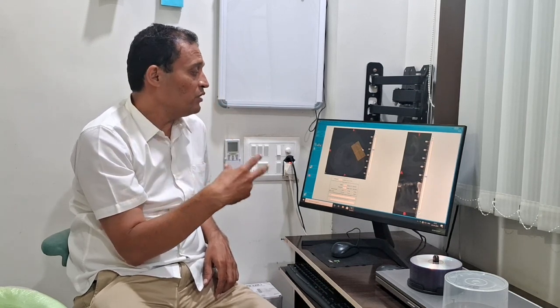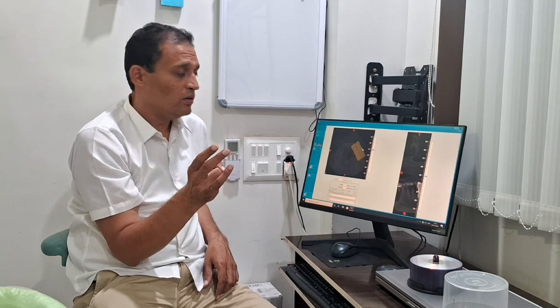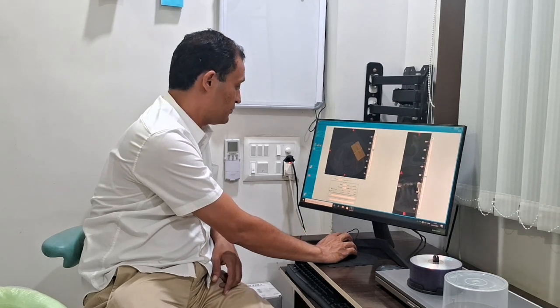This helps in the premolar areas to see the two canals. For detailing of that particular area, we can create a cross section in any plane. Now coming to specifics, it's very helpful in the premolar area, third molar area, and implant planning. Now this was the second part of the software.